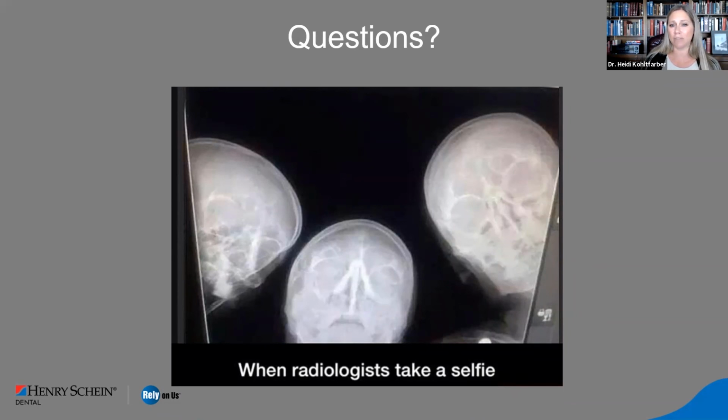Many times they don't have any bone in that area. We want to make sure we're not just placing it within the soft tissues of that cleft or whatever else they might have. So we really look at the CBCT and evaluate what bone we actually truly have and whether we need to have a bone graft in that region.